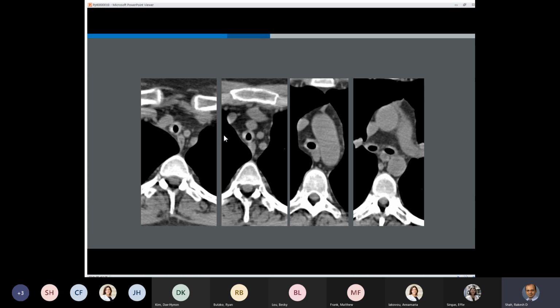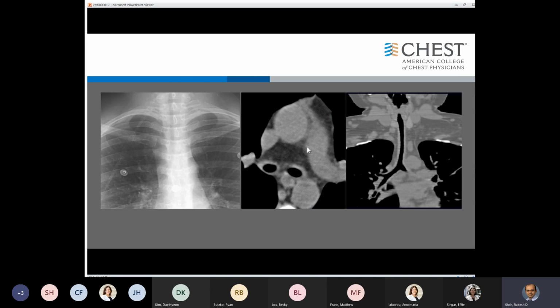One of the things that would cause thickening of the airway but sparing the posterior membrane is relapsing polychondritis. If one were to do the dynamic expiratory imaging, you would see that this would be unable to maintain its shape and it would collapse like the other case. So here it is, a very long segment narrowing. It causes diffuse thickening, and you can see the thickening of the trachea.